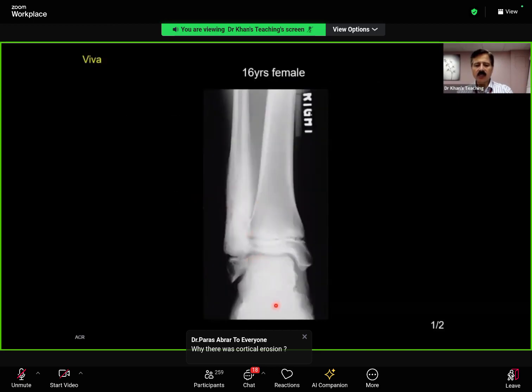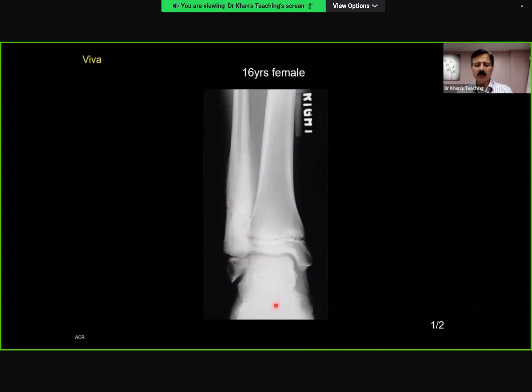What happens in the narrow bones, in the fibula as well as the ulna, is that the classical teaching of eccentric versus central does not hold true, and these kinds of cases will confuse you always. I'll show you more, where in a narrow bone like the fibula or ulna, the principles differ for the simple reason that there is not enough place within the medullary cavity, so it will appear more central.